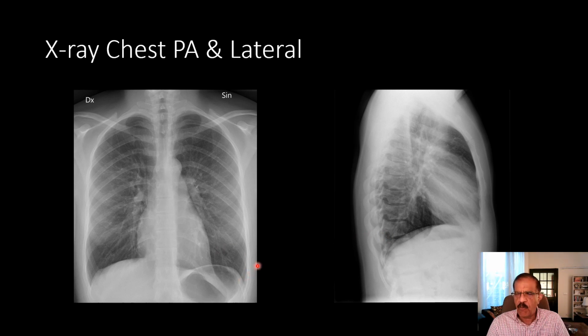So what is the importance of this concept? That it is possible that a small pleural effusion is seen only on the lateral film and not on the PA film. Of course, now we have other techniques also, like a small effusion can be determined on ultrasound if X-ray doesn't show it, but one way is to do a lateral film.